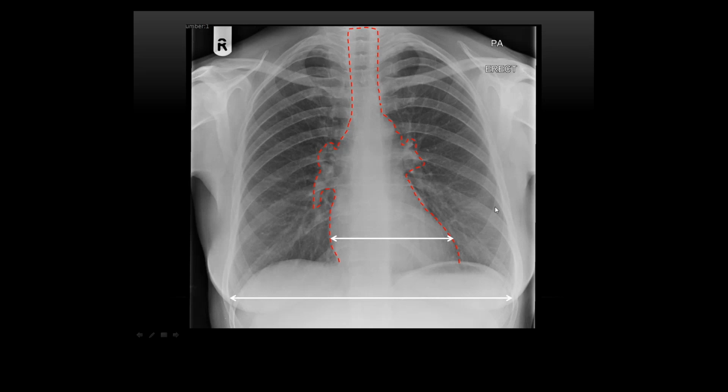So you don't lose any definition, because the pericardial effusion contains the cardiac silhouette, and you've still got the normal dark lung next to it. What actually happens is the heart becomes denser, it becomes whiter on the X-ray. Now the reason for that is just to do with the physics of X-rays. I'm not sure how much you guys know about this, but basically, anything that's whiter on a chest X-ray means it's absorbing more X-rays. More X-rays aren't getting through the patient onto the detector.